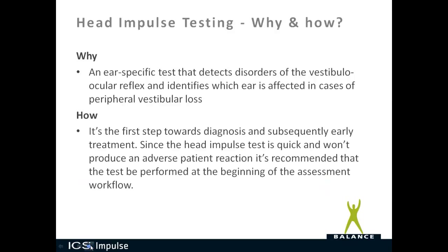Why do we do head impulse testing? Well, a head impulse test is an ear-specific test that detects disorders of the vestibular ocular reflex and identifies which ear is affected in cases of peripheral vestibular loss.